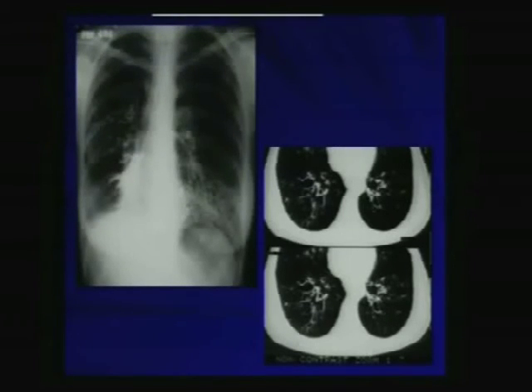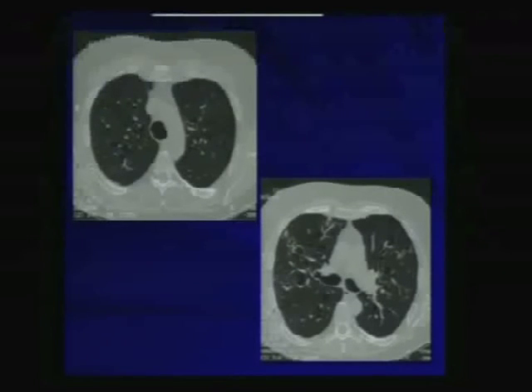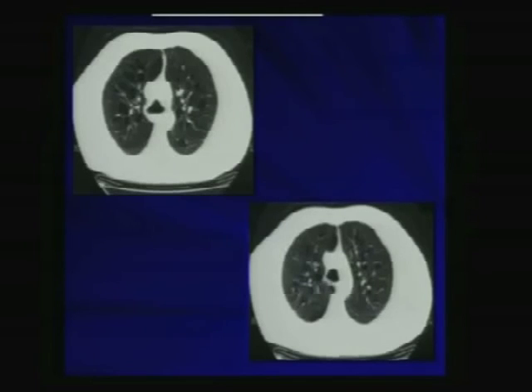So this is an easy way to make the diagnosis of bronchiectasis, but we can consider it, in advanced changes, as a patient with cystic disease, but it's really airway disease if you want to go by definition. Here's another patient with tracheobronchomegaly with cystic bronchiectasis, the same thing here and the same thing here. So this is an easy diagnosis to make as you can follow it with the anatomy and the branching of the bronchi. Here's another patient, again, with cystic bronchiectasis.